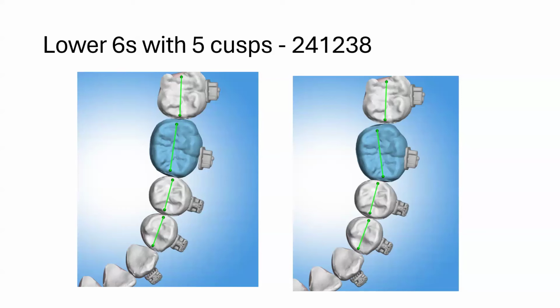I'm going to cheat a little bit because I know there's one way to visualize that. You're looking at the predicted outcome. Do you put the wire in to see where there's potential wire bends? In DIBS, you can adjust your settings so that it does not reflect wire bends, and it just shows the true expressed torque in the system. That is what I look at, the expressed predicted torque, and whether that's meeting my treatment goals or not. Okay, excellent.